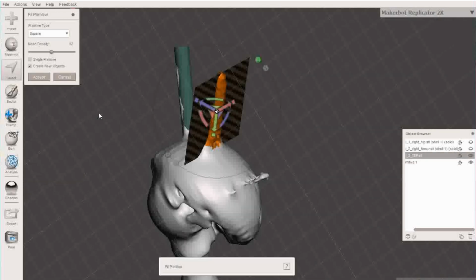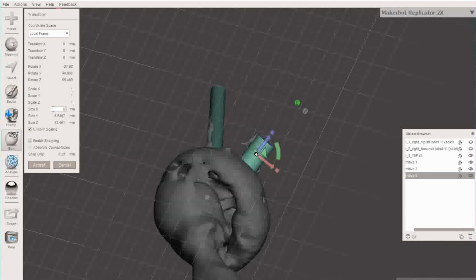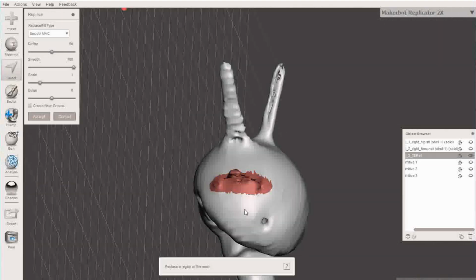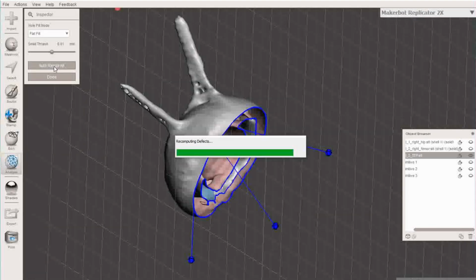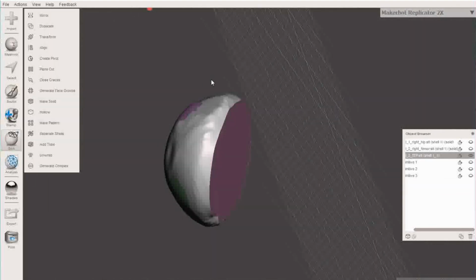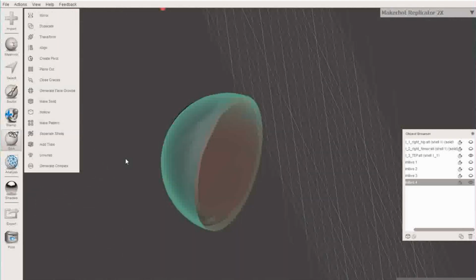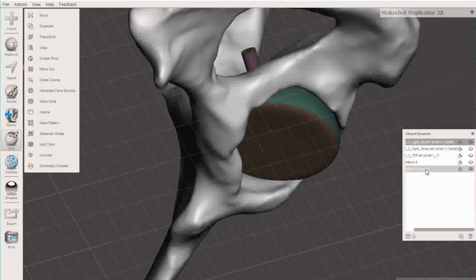During the segmentation, the implant was created as a single solid part. To enable the required full mobility of the joint, the 3D model had to be divided into its main components. Therefore, the implant socket and ball joint were separated and completely remodeled. By using HumanX internal database of different types of implants and screws, we also replaced the segmented screws to achieve a highly realistic appearance of the model.